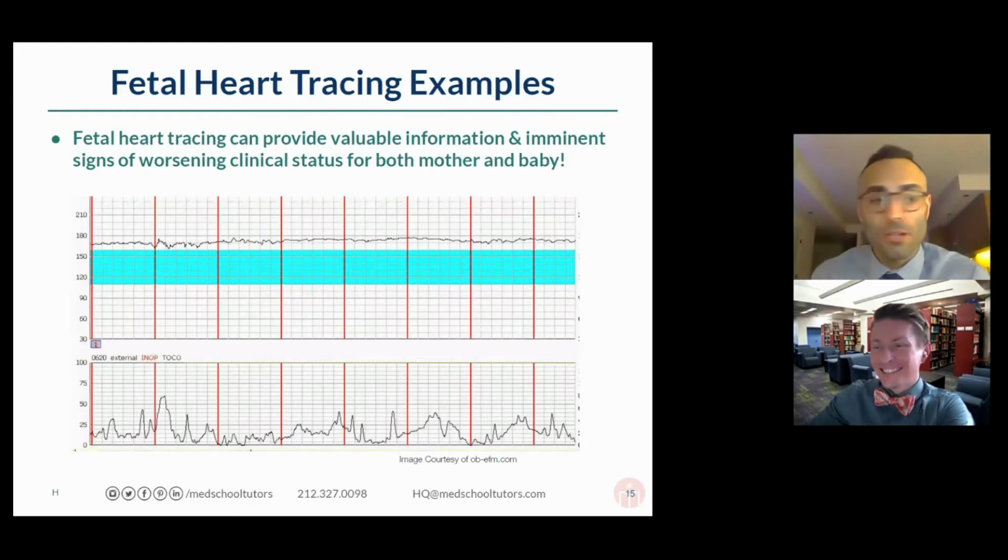So that's correct. As we looked at, and remember that little highlighting part that's indicative, the normal heart rate's not going to be there, as Joe was saying in the beginning. But you can clearly see that in the fetal heart tracing, it's about 175, 180 beats per minute, which is not normal. And you could see that with the context of the vignette, that the baby is in distress.